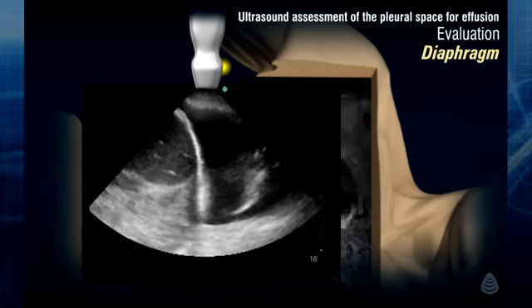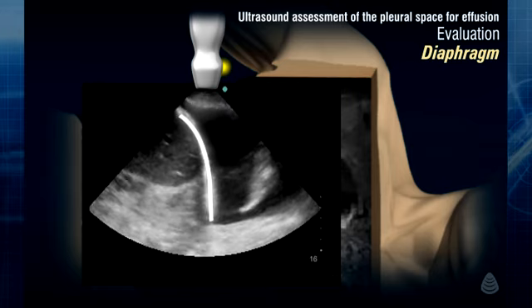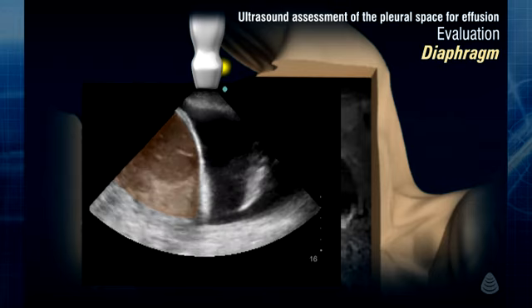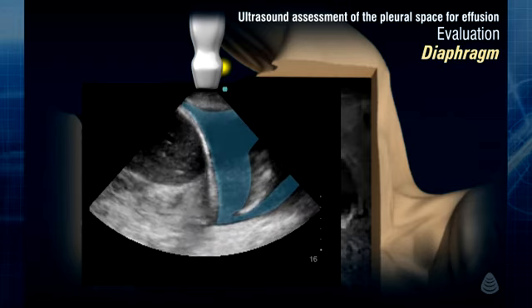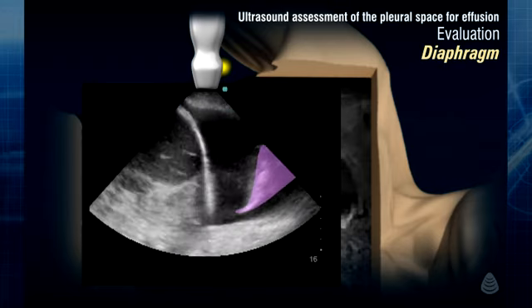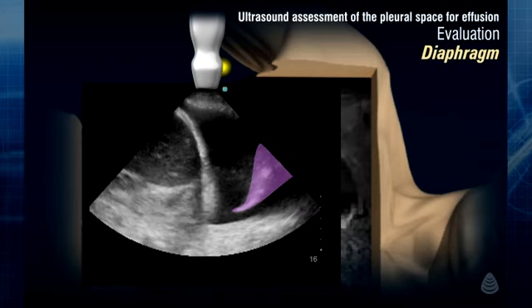This other sequence clearly shows the echogenic diaphragm and subdiaphragmatic liver. An anechoic pleural effusion is identified. The atelectatic lung and respiratory motion of the diaphragms are well identified.